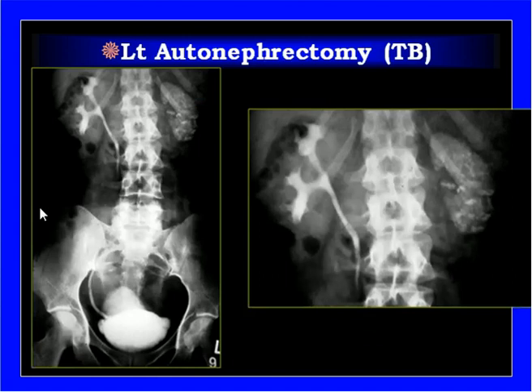Another case of left autonephrectomy. You can see the difference between the size and appearance of the kidney. No contrast is excreted from the left side. On the right side, the kidney is normal, the ureter is outlined, the calyceal system is normal. Cystogram remains normal.